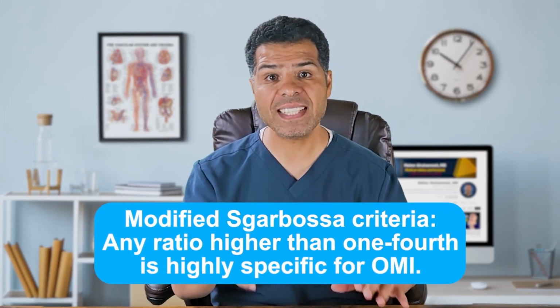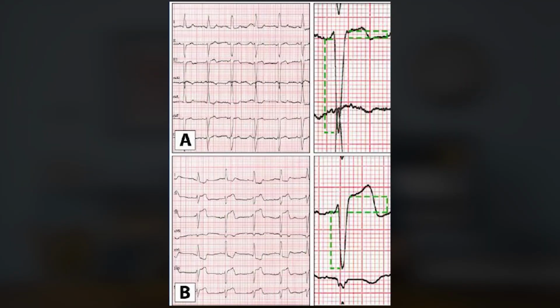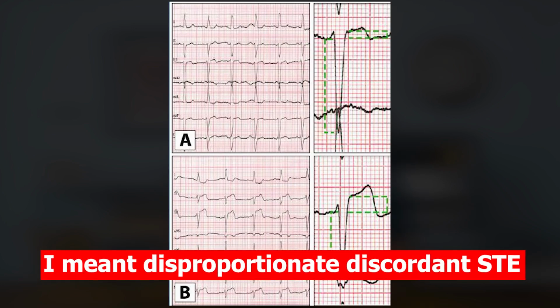Now, it's easy to identify concordant ST elevation, but how do we tell if there is an excessive discordant ST elevation? Here we use something called modified Sgarbossa criteria, which uses the ratio of ST elevation at the J point to the preceding S wave. Any ratio higher than 0.25 is highly specific for occlusion MI. Take a look at this image. The ratio in A is less than 0.25 while more than 0.25 in B. In B, it's called excessive discordant ST elevation.